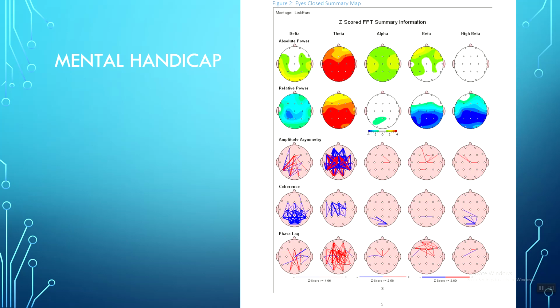Now, this is something to write down in your notes. The marker for clinical significance in terms of standard deviations is 1.64 standard deviations on either side of the norm, and some people think 1.96. What I'm really telling you is that once you get to about 2 standard deviations is where it gets interesting. But between 2 on either side of that spectrum, largely neurotypical, right? We don't have to get super excited unless we're digging for something that's not making itself apparent. So that top row, that all makes sense, right? This is how this person ranks relative to other people their own age who are healthy.